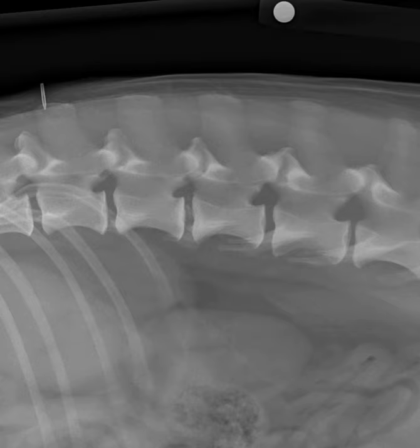So taken together, narrowing of synovial articulations, narrowing of the disc space, mineralization of the disc, narrowing of the intervertebral foramen, without any evidence of an aggressive process or discospondylitis elsewhere, I would be very concerned for intervertebral disc herniation at this site. Whether this is an acute thing related to the current signs or a chronic thing that is not of current clinical relevance cannot be determined accurately from radiographs. I would then suggest, depending on clinical signs, MRI or CT examination. Be sure to review the full report associated with this case.